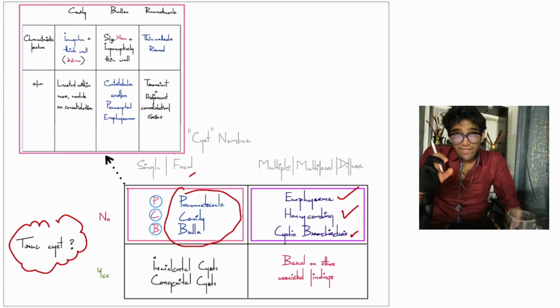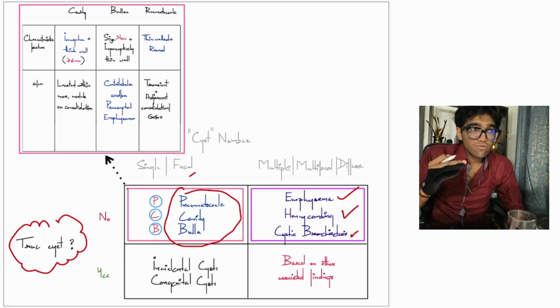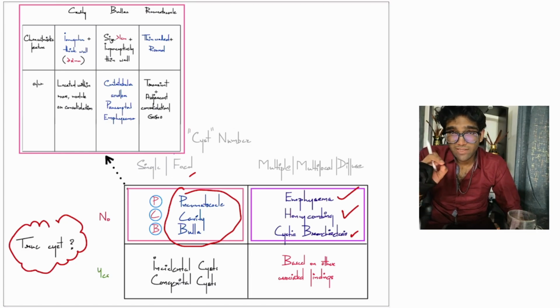Bullae are usually very large in size. They are not small like cysts. Cysts can also be large in size, but typically the largest of cysts are less than 1 centimeter, 10 millimeters in size. The other thing is bullae are found in the spectrum of emphysema, so their walls are imperceptible. The last is a pneumatocele. A pneumatocele has a very thin, imperceptible wall and is a round structure, usually very small in size. And by definition, pneumatoceles are transient.